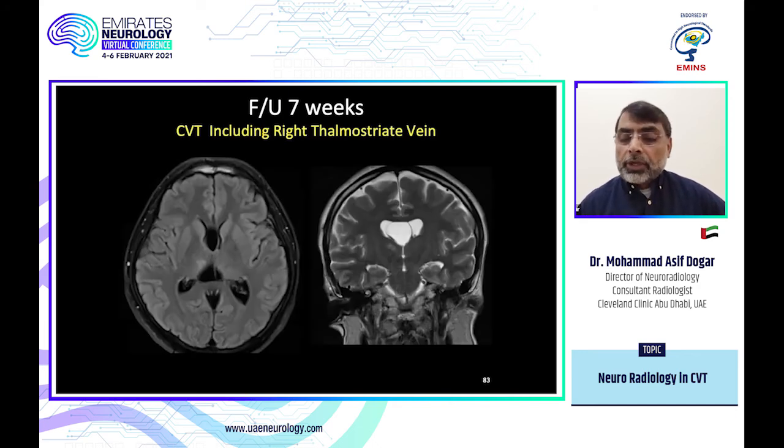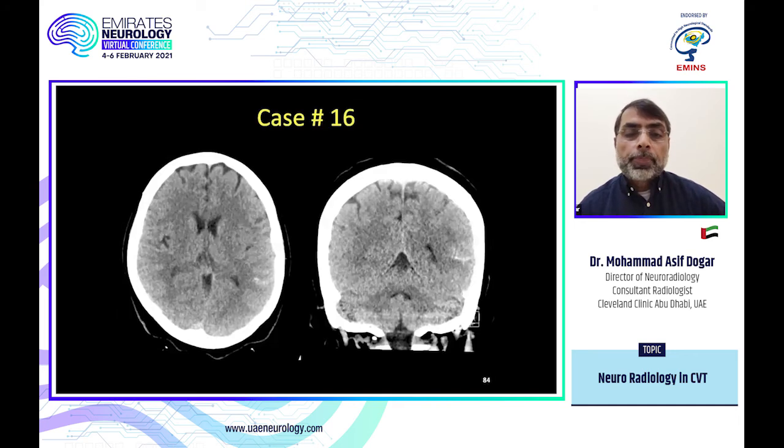And they treated with heparin, and on the follow-up, you can see almost all the findings are resolved. So it's kind of a strange unilateral presentation with one side thalamostriate vein thrombosed.